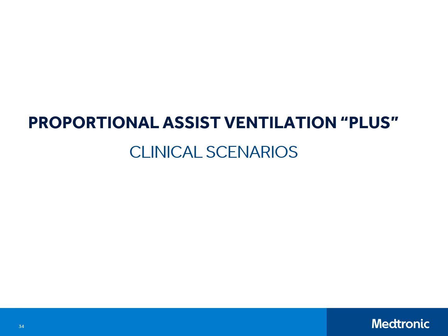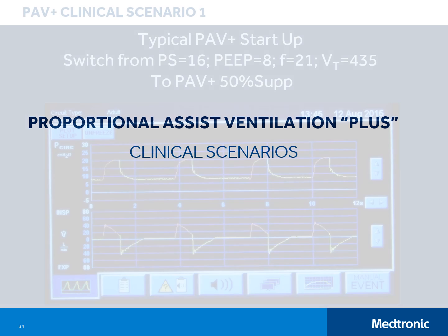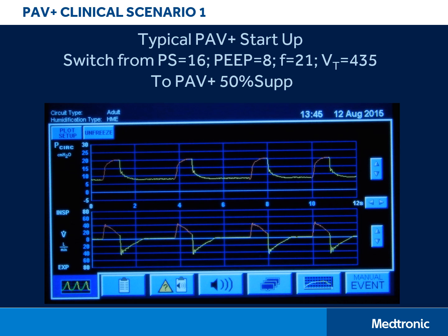Finally, to round out this training session, we will provide some clinical scenarios that may help to reinforce some of the differences between PAV Plus and pressure support ventilation. Here is a screenshot from a simple, uncomplicated patient breathing on pressure support with reasonable efforts. Let's see what happens when we switch this person to PAV at 50% support.